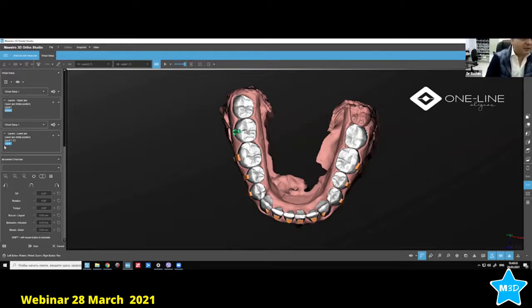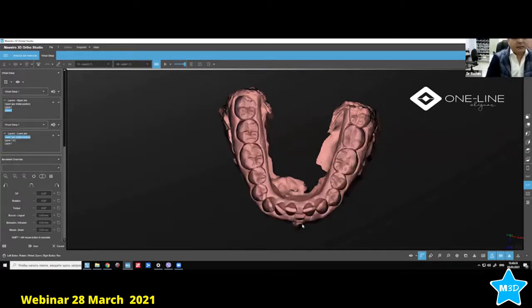So let's see this patient, right? If you are here, the 1 millimeter will not even enter. It's too much, the arch is too crowded for it to enter. So 0.75 3-layered, which is very, very flexible, is a good thing. Or 0.5, as our friend Nicholas used it, which I do agree with maybe in the beginning. So somebody may want to use 0.5 or 0.65 in the beginning. So we also have CA 0.65. It's the medium one from the clear aligner.